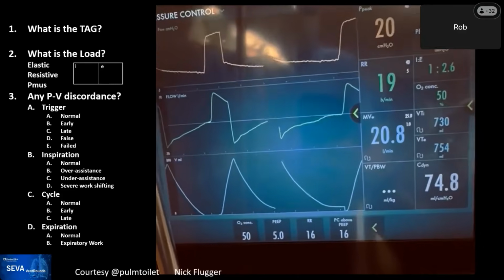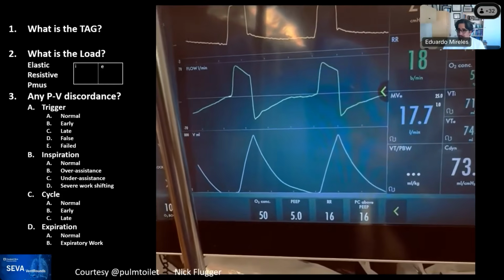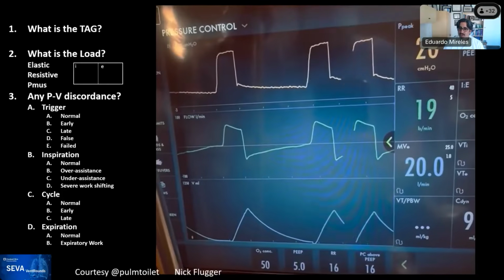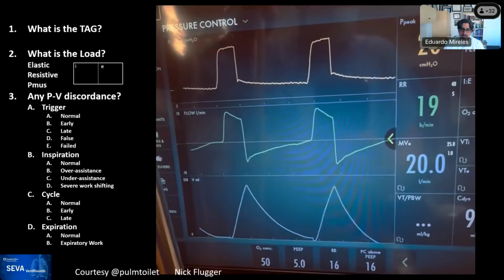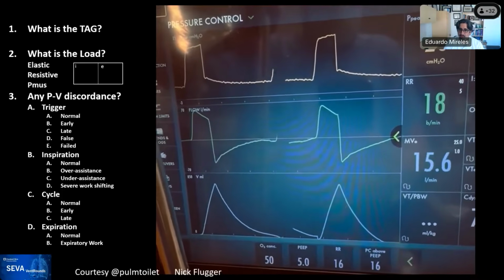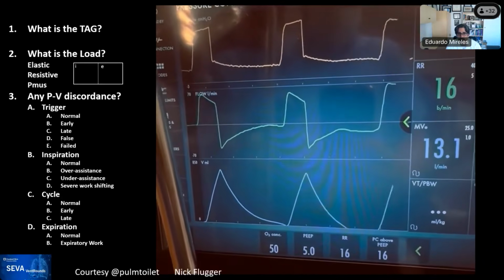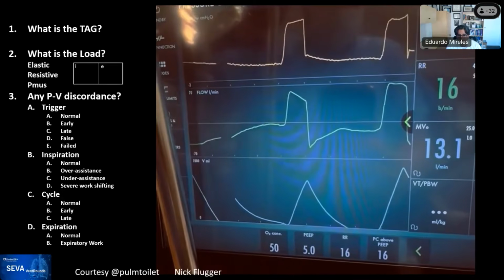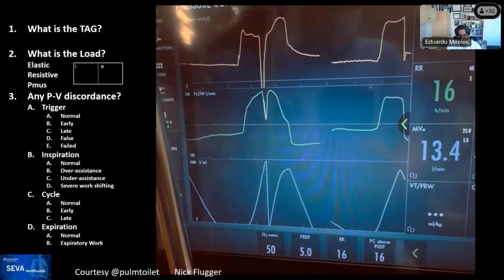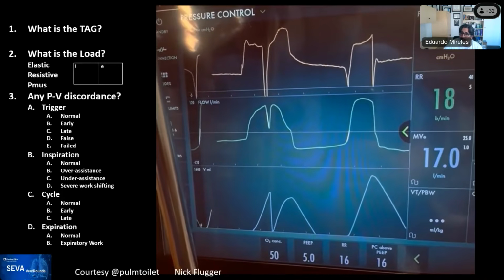Yes, Mohammed, we need to treat the main cause of the Cheyne Stokes breathing, if it's treatable, and sometimes it's severe heart failure or brain injury, and there's no good option for this. Just recognizing it. This patient is still on a high FiO2, which I presume is from some other sort of injury, or perhaps heart failure or pulmonary edema.